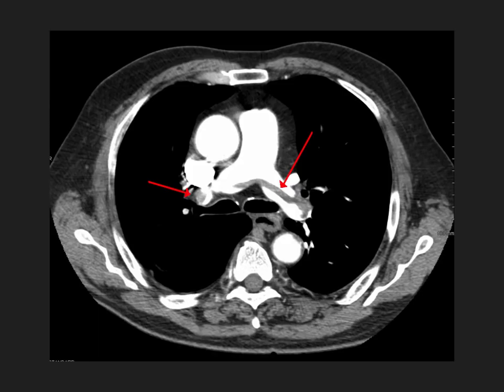So here's our first abnormal CT. Of course, you see the red arrows pointing to something, but I'm going to pose the question to you, what's going on here? I'll give you a couple of seconds to think before we talk about it. So pause the video if you need more time, but what we're seeing here is a pulmonary embolus, specifically a saddle embolus. Now it's called a saddle embolus because it kind of saddles itself over the pulmonary vasculature right at the bifurcation of the pulmonary vessels.